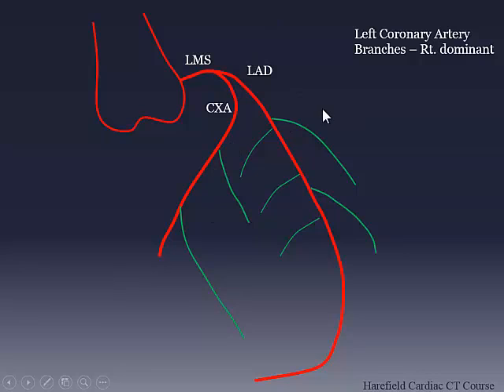The LAD, we try to follow the angiography convention. So where you see the first diagonal splits the LAD from the proximal to the mid. Now, because we don't see D2 often, or even some of the diagonal vessels, the way that we report the LAD is a little bit different from coronary angiography in that once we've identified the proximal, to separate the mid from the distal, we basically use the arbitrary value of looking at the length of the vessel from the LV apex and splitting it about in half. Okay? So it's a little bit more arbitrary than on angiography where you'll define it based on the branches.